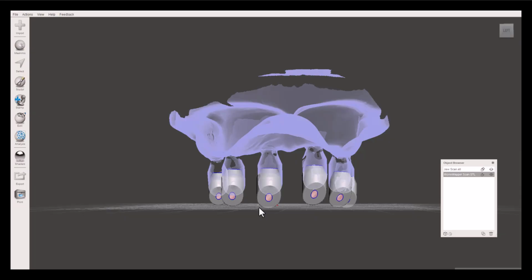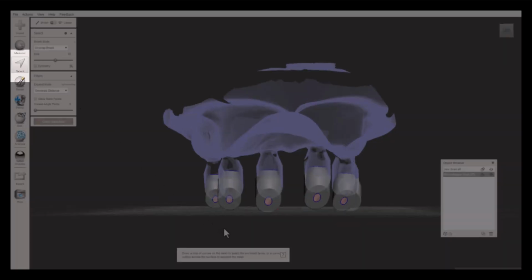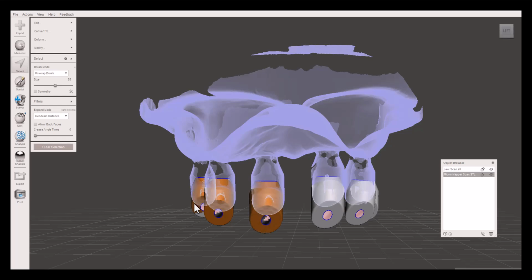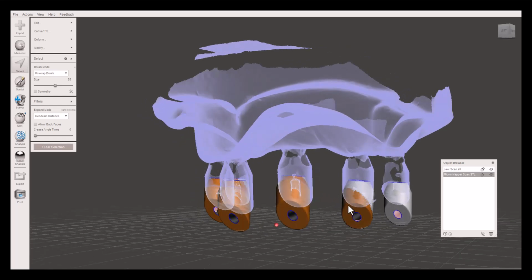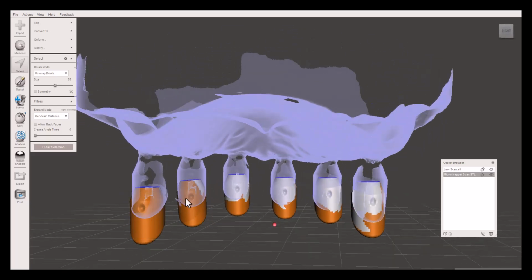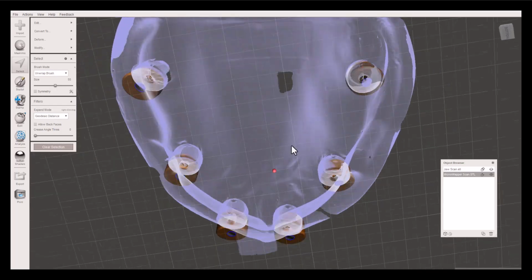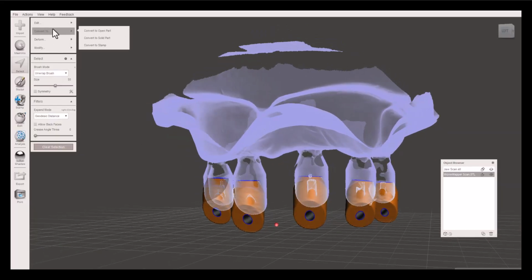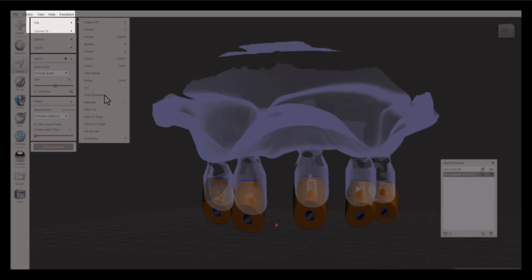After the target is selected, we can now switch to the scan markers. Next, area selection for alignment is required. Press on Select and use the brush to paint scan markers with your left mouse button. Once the scan markers are painted with the brush, we can go to Edit and select Align to Target from the drop-down menu.